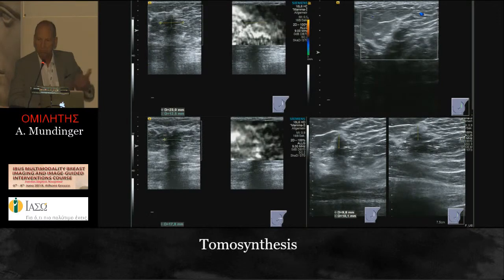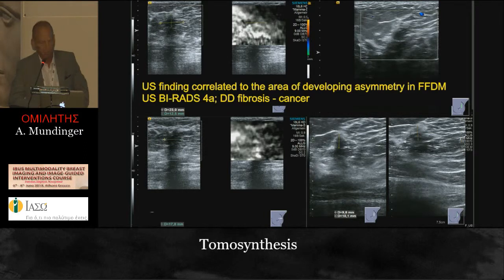So finally, this is a good argument for DBT, and this is the ultrasound of this new developing lesion. And if you see this fundamental image, you might be a little bit concerned. There's a shadowing, but in this Siemens elastography, it's not really hard, it's not really hypervascularized, and these are images without and with compression, and so most of this looks not so difficult and suspicious afterwards, but finally we cannot exclude cancer.